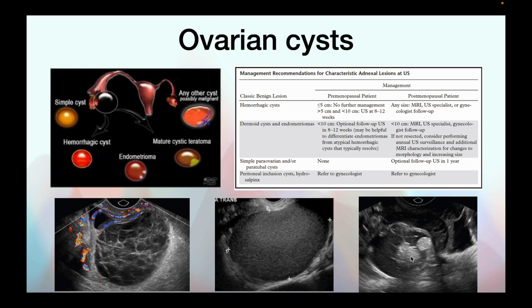Now, this cystic teratoma, again, you see different composition materials in the cyst itself, some with shadowing, some that are more lipid in nature, and then some that are more serous in nature. At this stage of your training, you don't really have to memorize what these different cysts look like, but this is just an introduction on very, very common ovarian cysts.